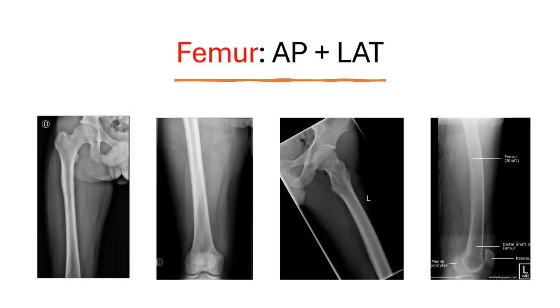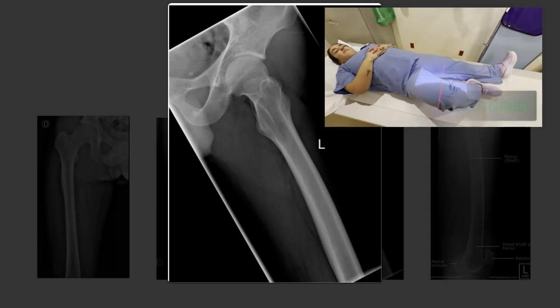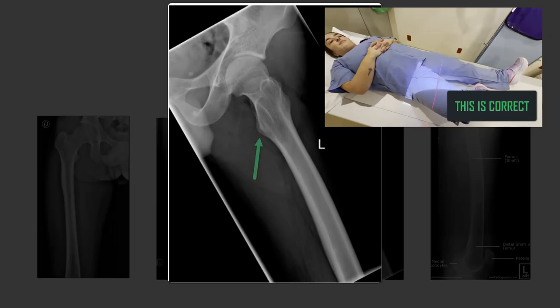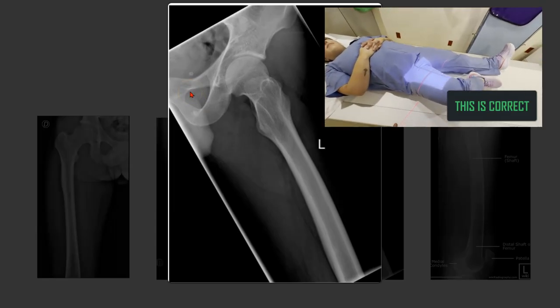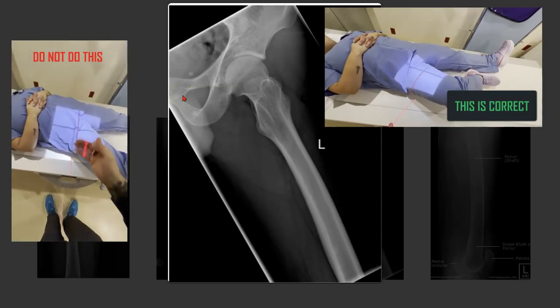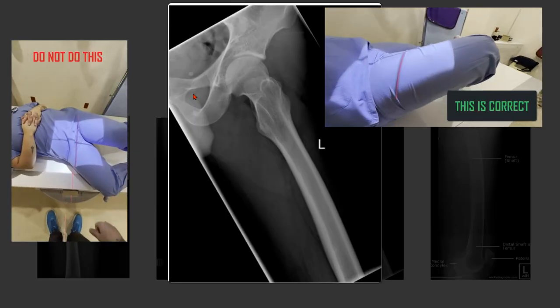And on the laterals, you can see here this person did a good job of keeping the patient supine and frogging out the hip. We have a nice view of the lesser trochanter there. And you can tell they're supine because of the obturator foramen here, still in profile, looking like it does on a supine pelvis. Okay, you would see this start to close off if you angle them towards the table.